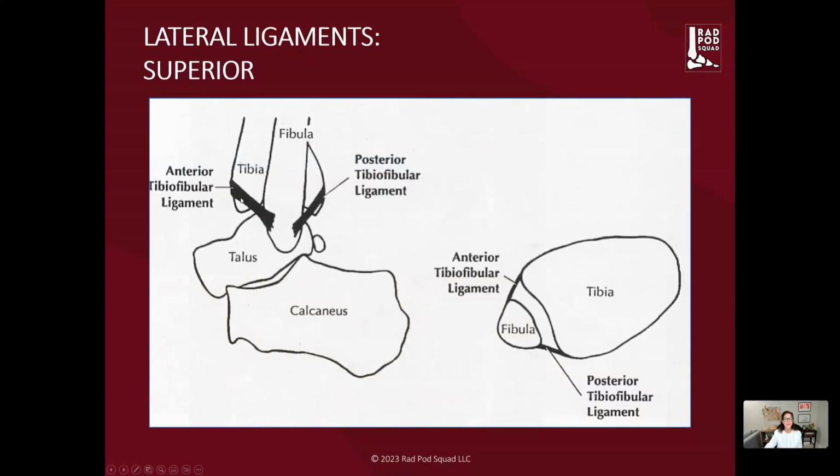First, let's just take a look at the schematic, looking at the tibia and fibula. That's our tibiofibular ligaments called the syndesmosis collectively, and the posterior tibiofibular or the posterior syndesmosis. Taking an axial representative slice through this region, we can see there are thin whispers of this anterior tibiofibular and posterior tibiofibular ligament joining our tibia and fibula.